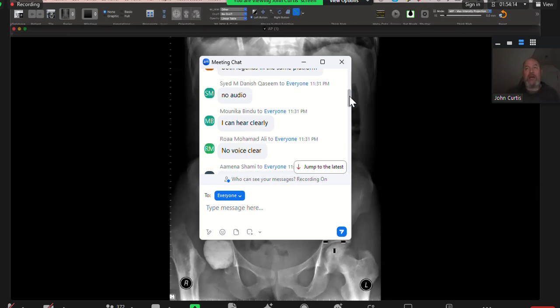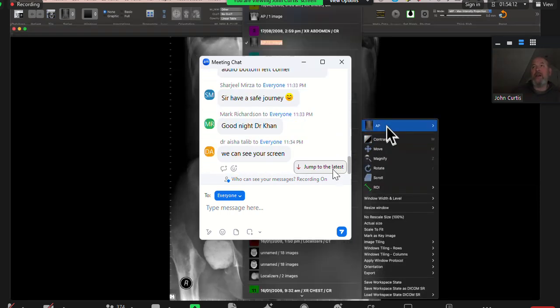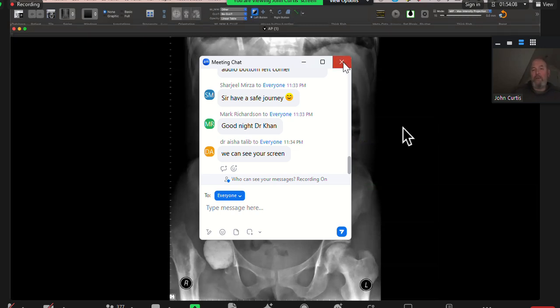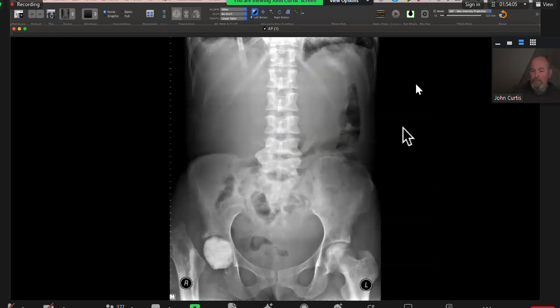Great. Okay. So candidate 1, if you go ahead and have a look at this and tell me what's going on. Abdo pain. Yes, sir. So I'm provided with the abdominal radiograph of a skeletally mature patient showing a calcified head of the right femur, and the shaft of the femur appears to be displaced laterally. There is some calcification noted in the left upper abdominal quadrant.